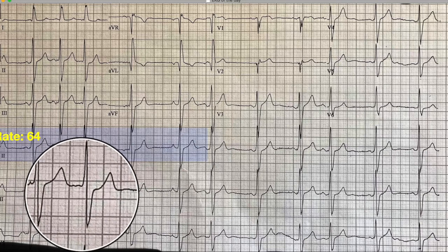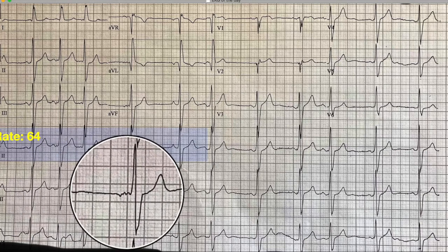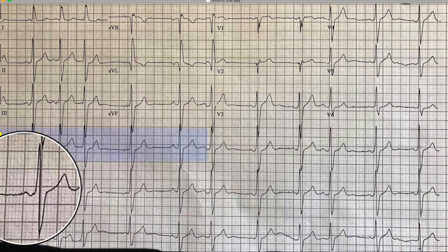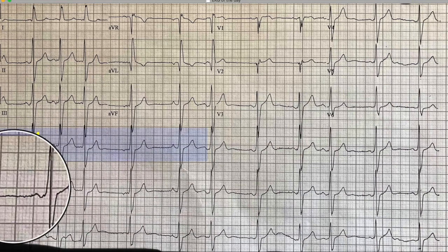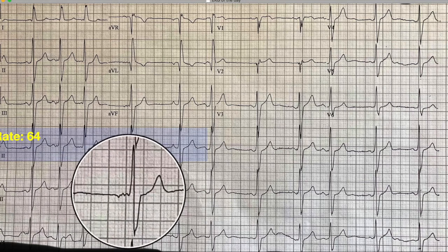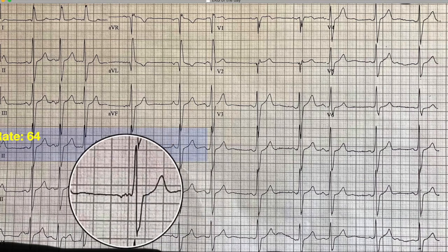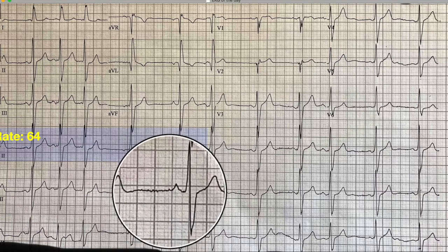Hard to tell on that one. Tough to see. This looks like maybe a P wave here. It looks a little different though. If you remember, these were upright P waves, still upright, upright. That one is negative. And there's still a QRS that follows it, so I still think it's a P wave. But that P wave looks a little funky as well.